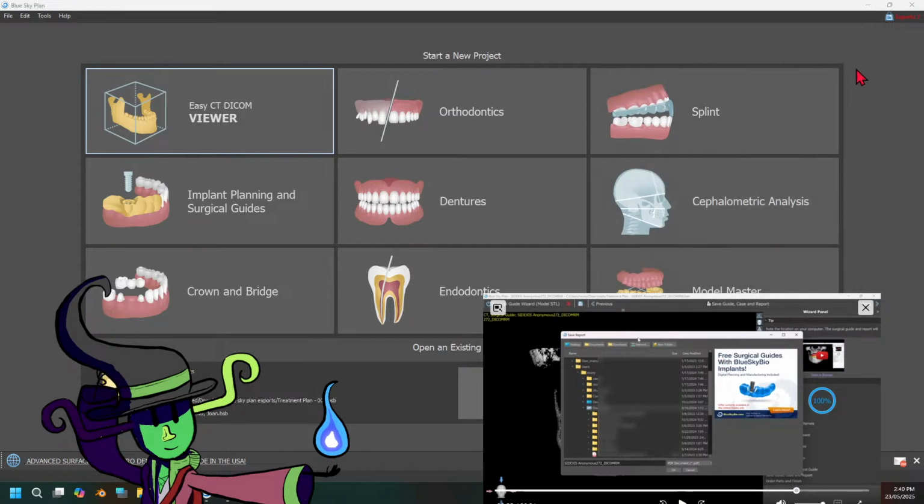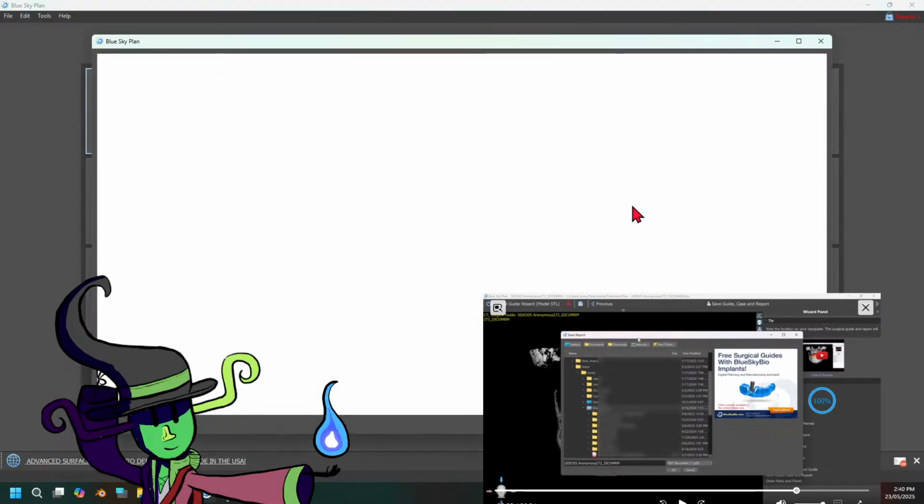You can sort of detect how many export points you get through what's on the top right here. You can see these red words here, and it says here that I have 3 exports left, which is exactly the amount of export credits I had before I streamed on this channel.